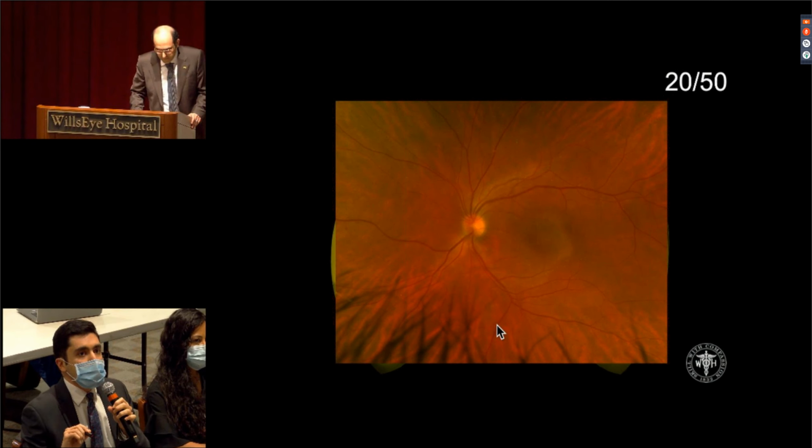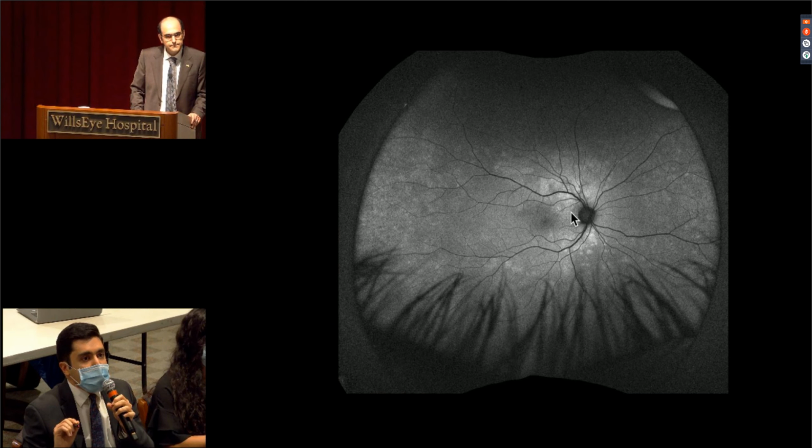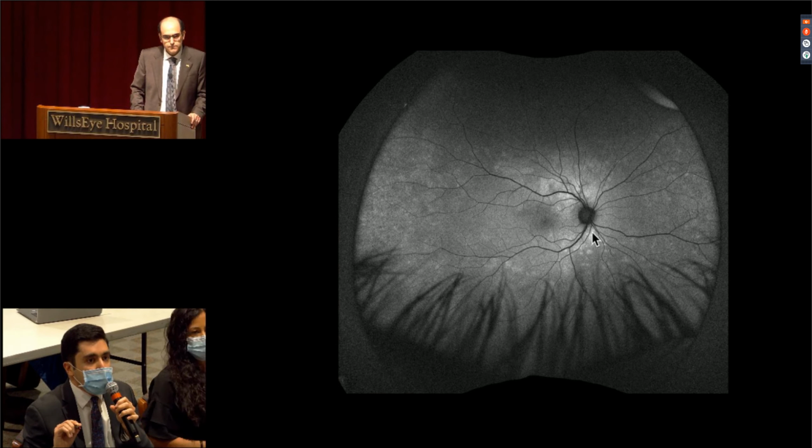Excellent. Wide field fundus autofluorescence of the right eye. And then our attention is drawn to these hyper autofluorescent changes. Again, here superiorly around the supratemporal arcade, kind of a little more diffuse and widespread than what we were seeing on the color photos, and also here inferiorly as well. More of a speckled appearance with these kind of distinct foci that we're seeing inferiorly.